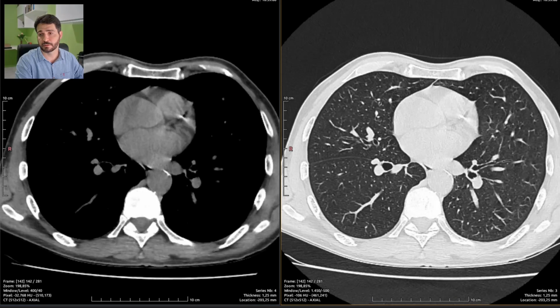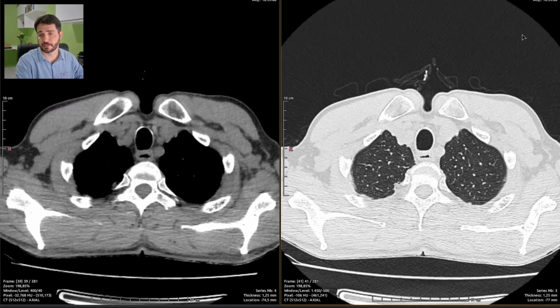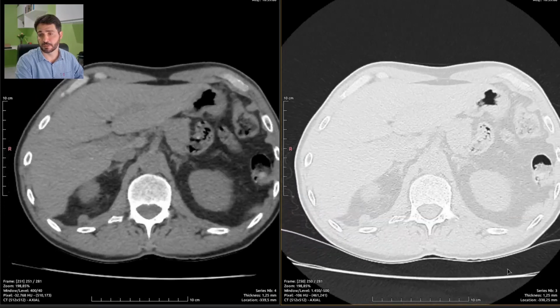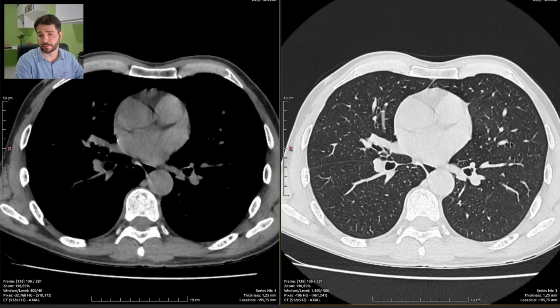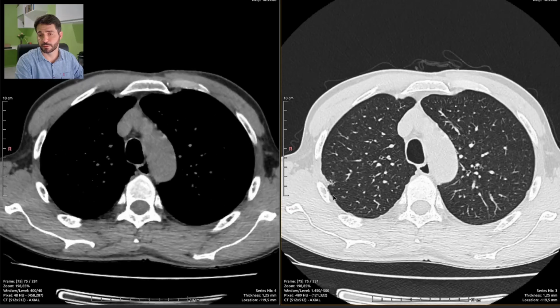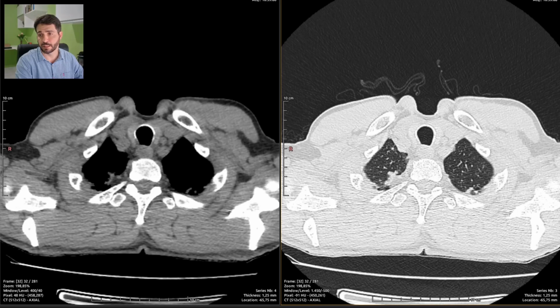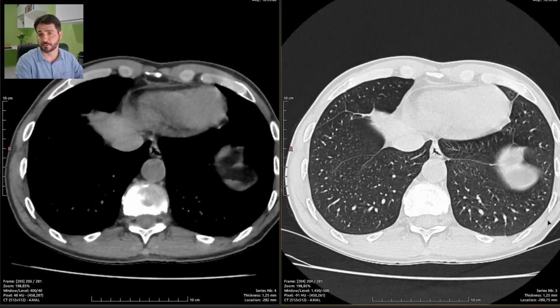6 millimeters. Yeah, I don't see much emphysema, nor bronchiectasis, nor parenchymal distortion that could relate to tuberculosis or heavy smoking, but this patient indeed has a bunch of nodules and micronodules, especially on the upper lobes, with irregular pleural thickening, and some bands on the apex of the superior lungs, superior lobes.